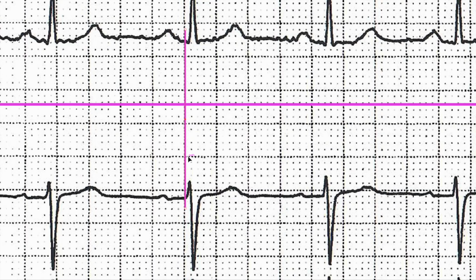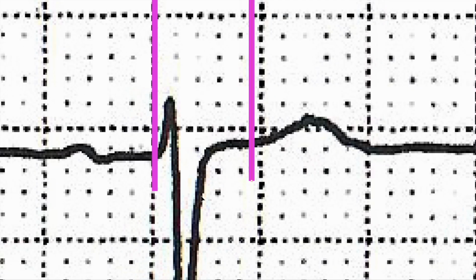See that? All of a sudden, we have a very different picture. So let me just copy this guy and look at this. Now, as far as finding where this QRS gets cut off, you need to understand how to measure, how to find your J point.